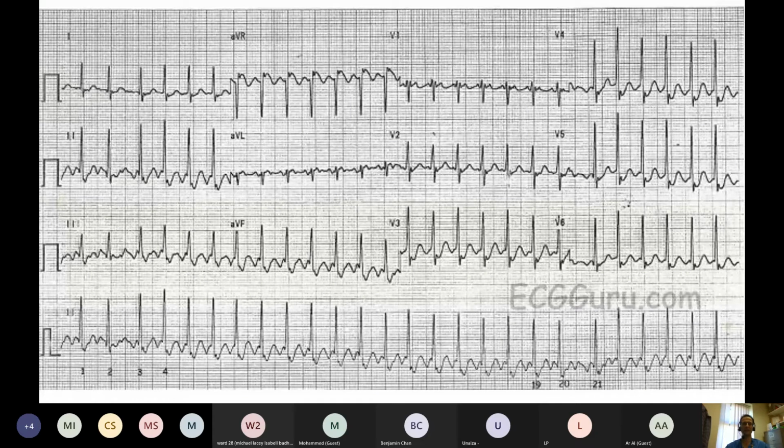Atrial fibrillation, very similar in so many ways, needs anticoagulating, almost sounds the same, but is incurable. It can only ever temporarily be improved and is a really challenging thing to try and keep you in sinus rhythm, in some patients. So atrial flutter, atrial fibrillation, very different. Often you see both together in a patient, but very different rhythms. So here you have the sawtooth on the baseline, and you have a rate of about 150 because the circuit is going at 300 and every other beat is conducted.